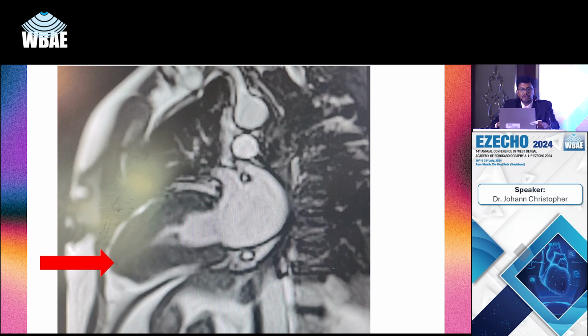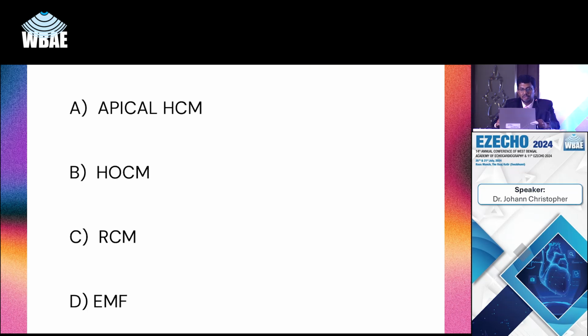Question 17 is a 58-year-old male post-bypass with GRD, and he was sent to me with a cardiac mass on the echo. So I did the MR, and you watch the cine carefully. It's a typical 4-chamber cine, and the RA, RV is there anteriorly. I will try to play this again.